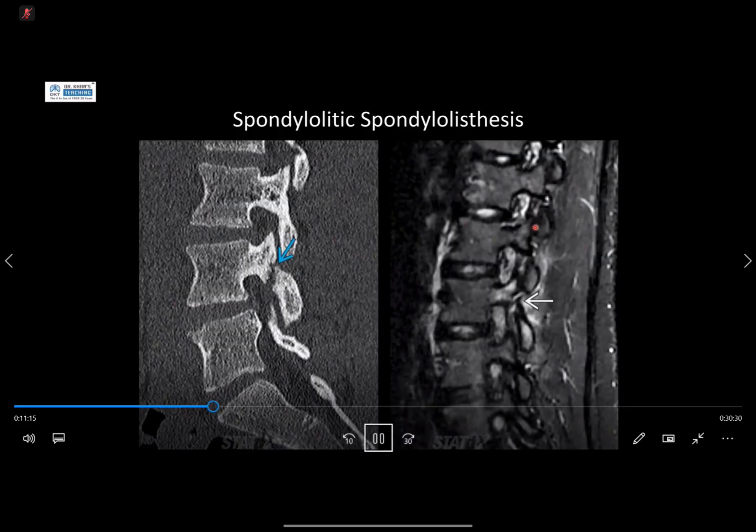Other examples of stress-related injuries is pars defect. Here in kids, not always, you get the slippage or the listhesis, the anterolisthesis. You know why? Because this thing sticks to here, and then you've got the two bits acting like hinges, protecting this from slipping forward. When you've got the fracture there, if it's bilateral in particular, then you lose that little grip between the bone edges, so this whole thing slips forward. That's why I've got an anterolisthesis of the upper vertebra relative to the lower vertebra.